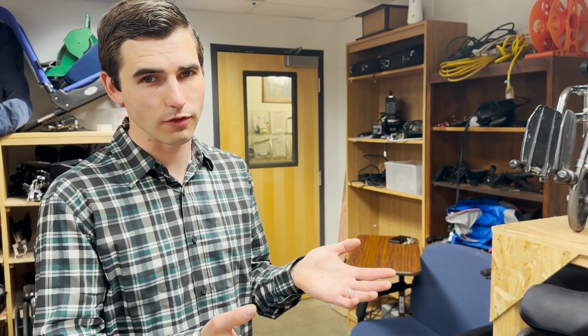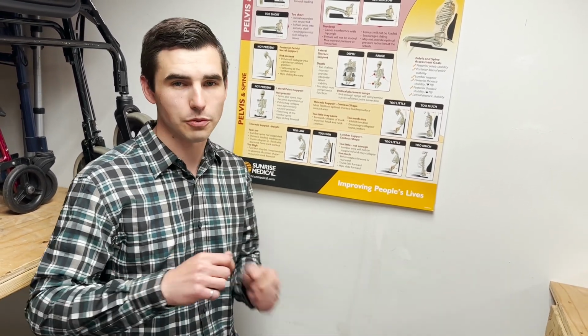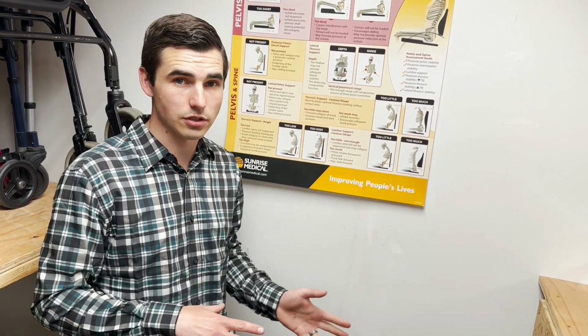That's how a pressure sore develops. Talking about those types of wheelchairs that are customizable, whenever they are sold to an individual, there is an assistive technology professional that comes out and measures the person's body. Those measurements are sent to the manufacturer, who then builds the chair to fit that person, because it's their environment. They're living in it all day long.